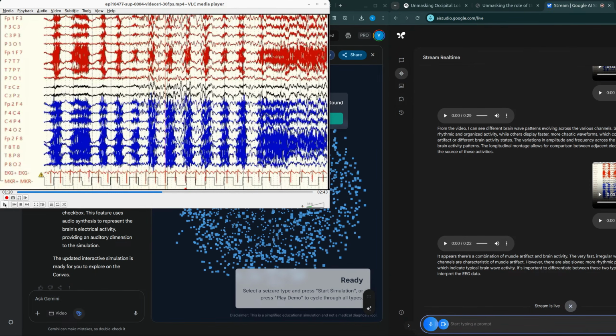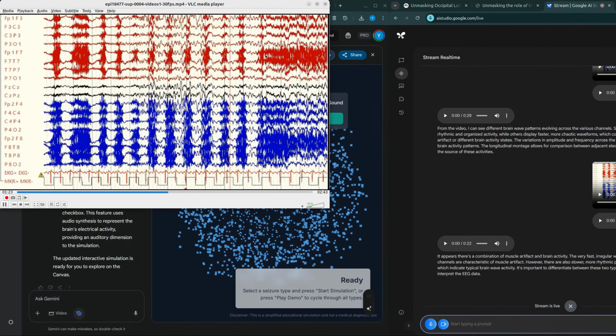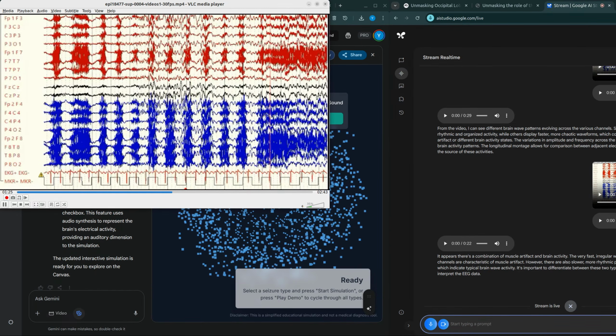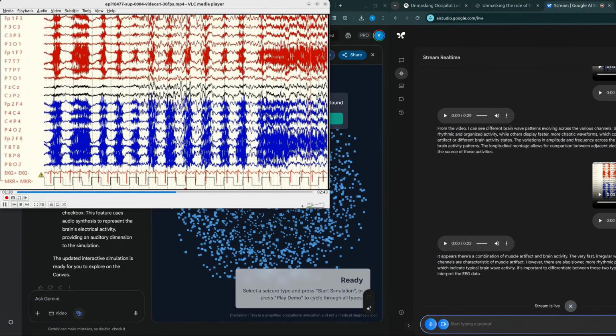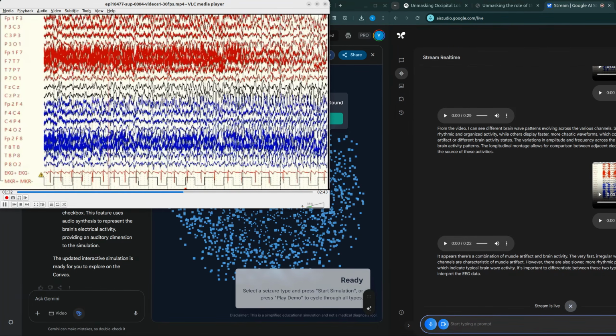Okay, I keep playing the video. What's coming? Can you tell if potentially there is no more EMG? Is there anything else going on? Can you tell?